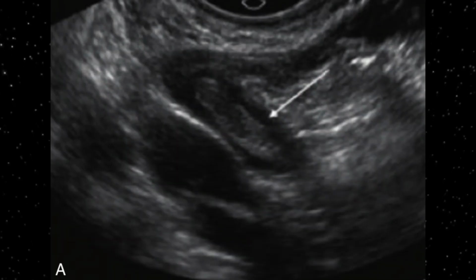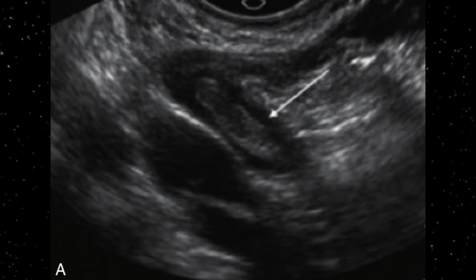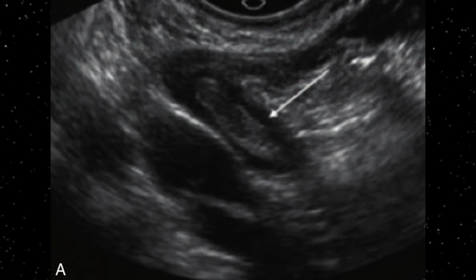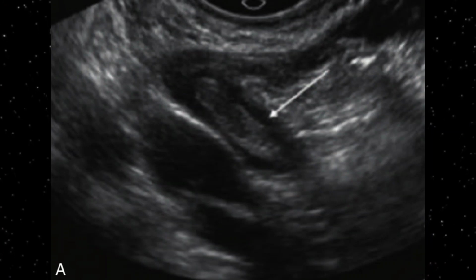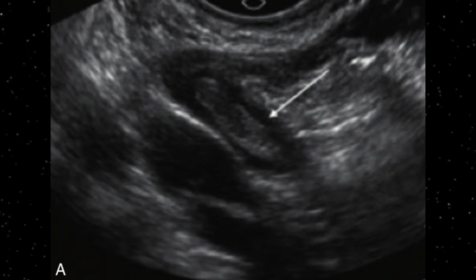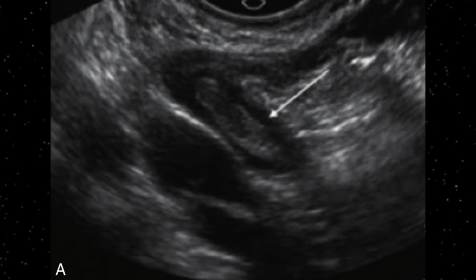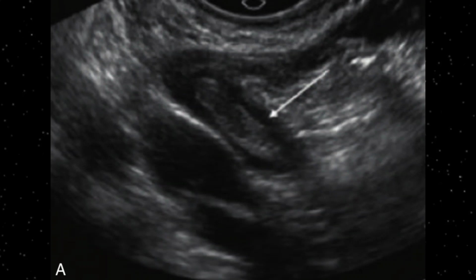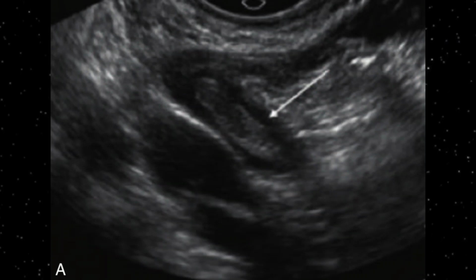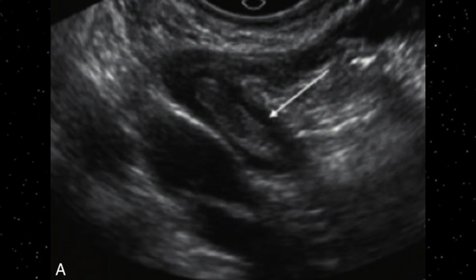This is a transvaginal image, and on this transvaginal image, the right-sided ovarian vein can be clearly seen, and it is filled with internal echogenic material, which is actually thrombus. This is indicated by the white arrow. Look at the ovarian vein, which is dilated and filled with echogenic thrombus. If you put the Doppler signal on it, there would be no flow, because this thrombus is completely occluding the ovarian vein. So this is called ovarian vein thrombosis.